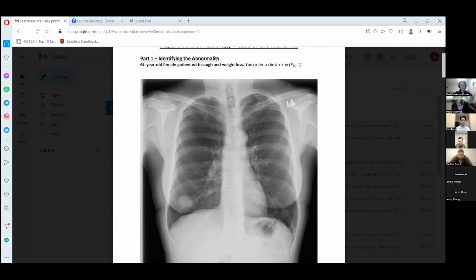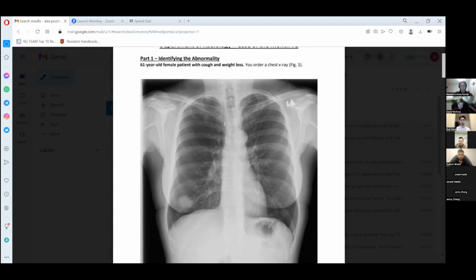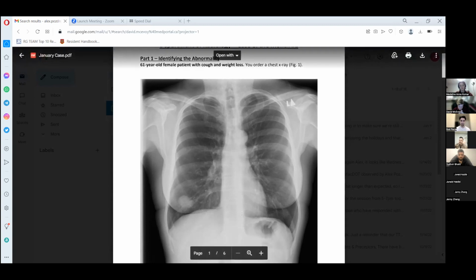So we can faintly appreciate the vertebral bodies, and also we can see how the vertebrae create these different lines, which are quite important. So if you have any disruption in these lines in the cardiomediastinal silhouette, this can clue you in that there might be something happening obscuring this cardiomediastinal border, and you might have some sort of a pathology inside the lungs or inside the mediastinum that sort of disrupts these nice straight lines.